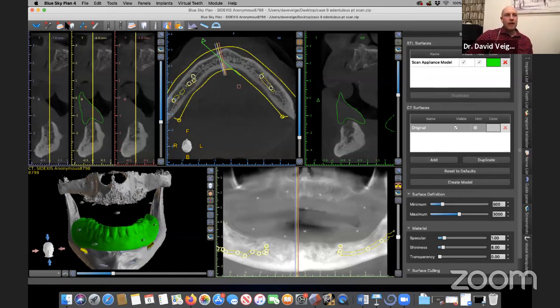So what I like to do is I like to then jump into my implant list here. There's a whole bunch of different icons at the top here. I like to keep it nice and simple here. This is all I really ever use up here. And really all I'm usually ever using is add an implant, draw my dental curve, add a tooth, or add a nerve. I sometimes want to measure things. So this is the measuring button. But other than that, that's really all I'm using. So there's only 4 or 5 buttons up here that you really ever need for the basic stuff.